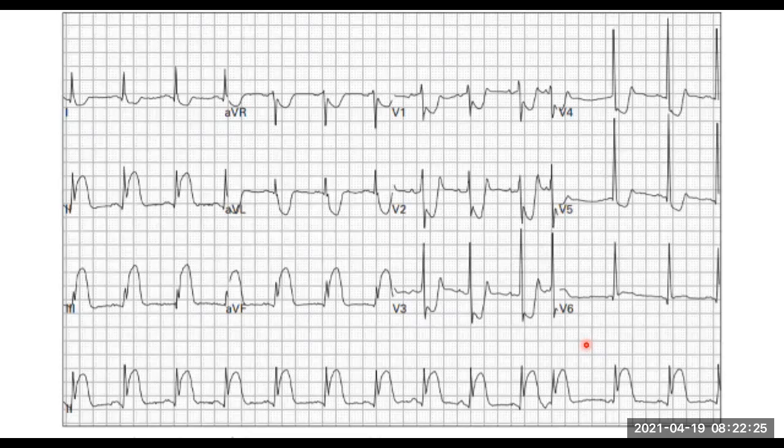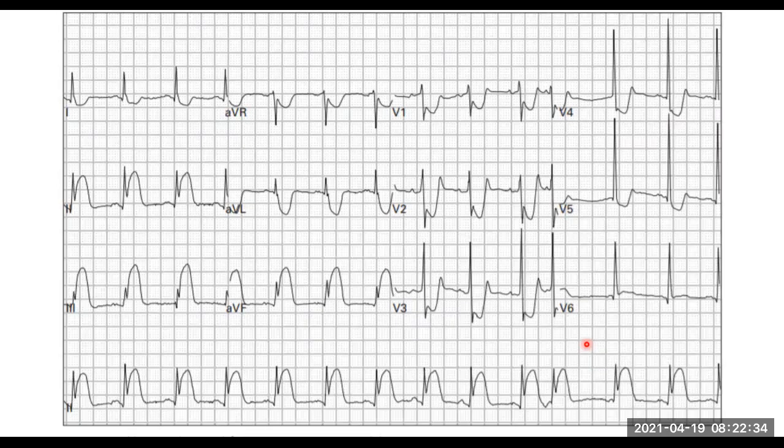So it's just that the atrium, for whatever reason, has decided it's going to contract early. It can point to a few things, but I don't want to get into that too much now. You know, things like accessory pathways and things like that, but we're not going to concentrate too much on that. Just that we can't really say we've got a sinus rhythm, but for the majority of the time we do. Let's say if we found nothing else wrong, you would go and do rhythm strips and check the patient for 3 or 4 minutes, see if this is recurring on a regular basis.